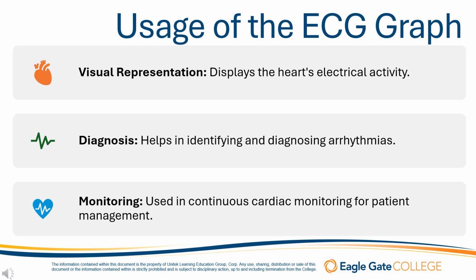And the ECG can also help us to identify structural abnormalities of the heart, such as hypertrophy, which is a thickening of the heart muscle. For instance, left ventricular hypertrophy, LVH, presents with increased amplitude of the QRS complexes. Identifying these changes can prompt further diagnostic testing like echocardiography.